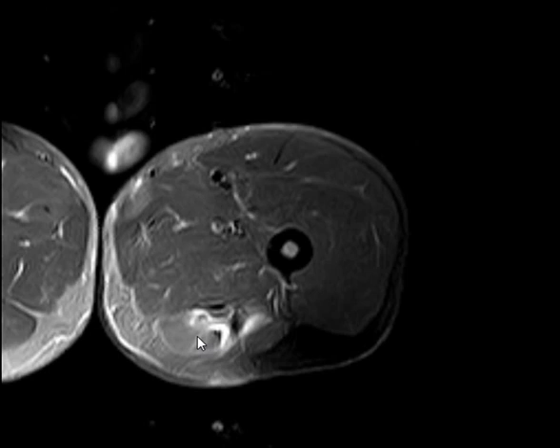I think we have time for one more case. I think you deserve it, we gave the first and the second and you solved them. Shall we choose something for you, or will you choose? Please choose a number and let me see. That's the way to approach it. If I'm at the clinic and a patient comes, I have to do it no matter if it's hard or difficult or easy. I have to report. That's a very good approach. So choose a number and let me see. 440.